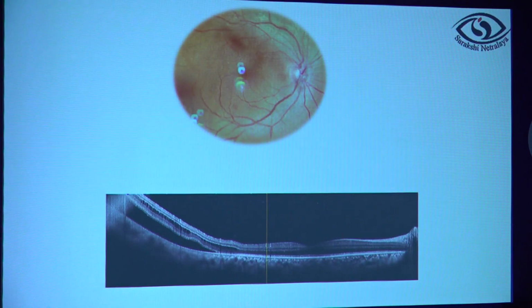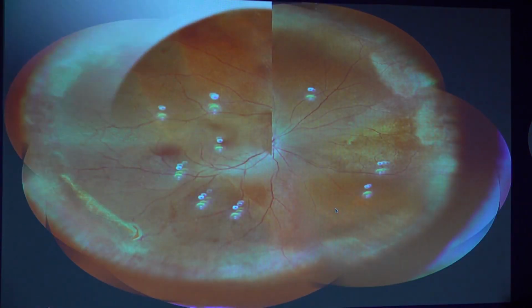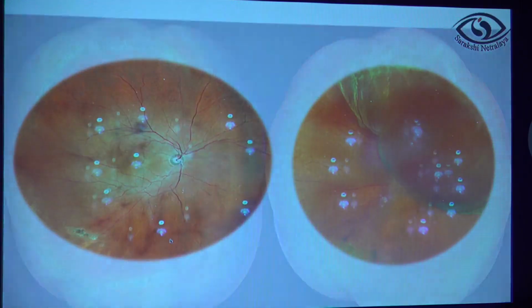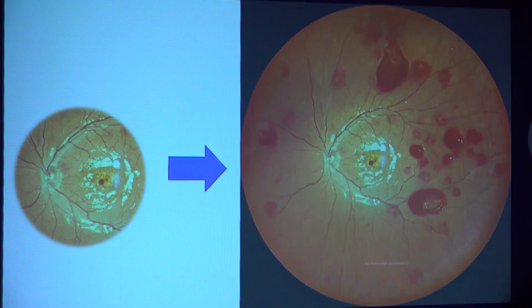Another case diagnosed to have macular edema was advised anti-VEGF. When we did a wide field photography, you can see a subclinical retinal detachment just encroaching the fovea with a horseshoe tear and a beautiful lattice there. So this is how it helps me in changing my diagnosis, or rather convincing. These are a few other photographs. I will just run through them because of want of time.